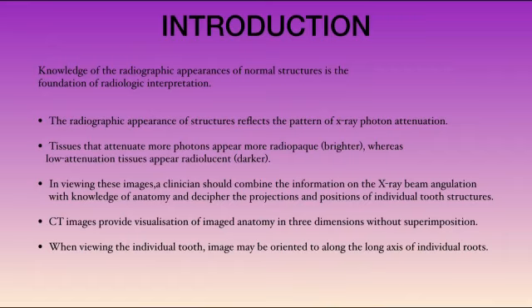radiologic interpretation. The radiographic appearance of structures reflects the pattern of X-ray photon attenuation. Tissues that attenuate more photons appear more radio-opaque, whereas tissues with low attenuation appear radiolucent. In viewing these images, a clinician should combine the information on the X-ray beam angulation with knowledge of anatomy and decipher the projections and positions of individual tooth structures.